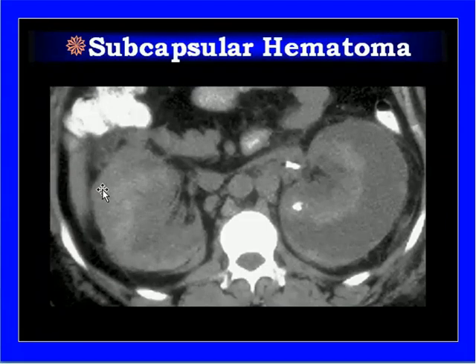Another case of trauma, subcapsular hematoma, on the left kidney. It is enlarged, with loss of normal renal pelvic system.